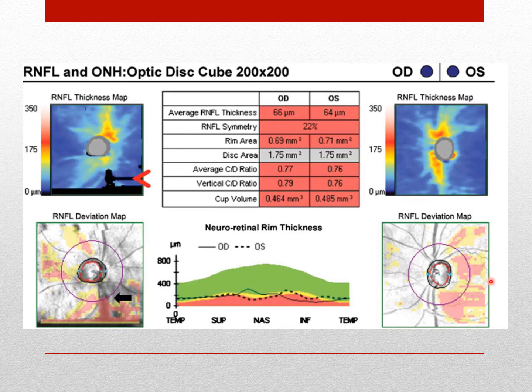Looking here at the left eye, you'll see true nerve fiber loss, because this is a good quality image scan. The left eye image was clear, no errors being seen in the thickness map. And then here you can look at the chart value. You see here in both the right and left eye, the optic cups are large. And let's see, in the disc area, I would say a moderate. But you can see here as well, nerve fiber thickness loss. Definitely glaucoma is at play here.